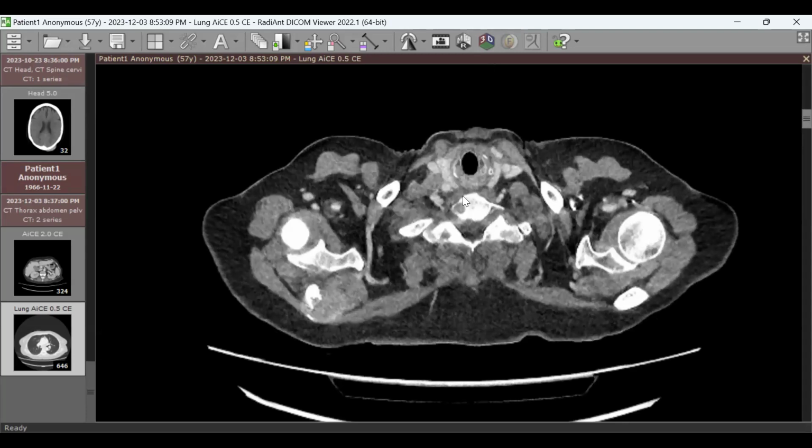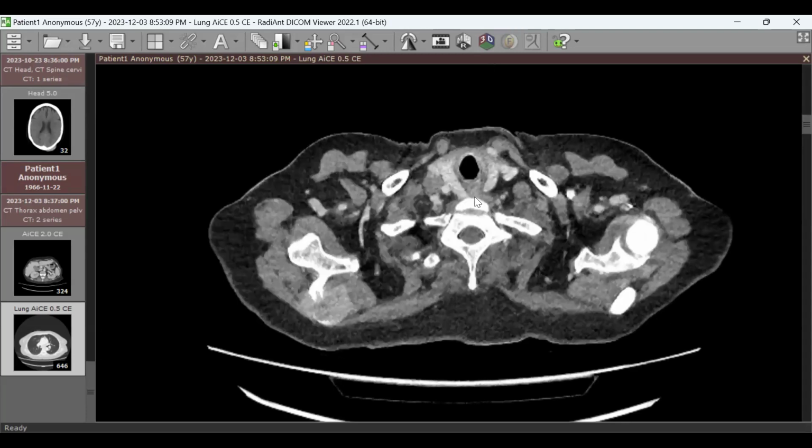See this one extends here? Yes. This is level 4 neck lymph node, which is also called medial supraclavicular. Okay. So if this lesion is rounded and looks pathological in density, just by this node, give me the N stage. This lymph node is not regarded as N, it's regarded as M. Why? Because it is not in the location for bronchogenic carcinoma. I think it's regarded as M.